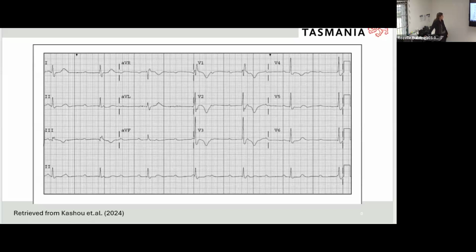Yes. So we've got a regular pattern in our P wave to QRS complex? I can't see a pattern. That's why I said third degree earlier, because I can't see a pattern. So on our first one, we have one P wave, then we have two P waves, then two, maybe three, actually no, two, and they're not associated. We have two more, they're not associated. So there's no real pattern. Is anyone in disagreement with that? The pattern, yep, agreed, Jack. All right, so we're suspicious it's third degree.